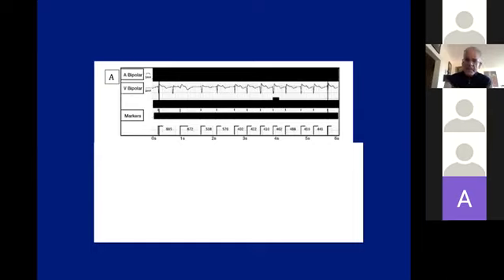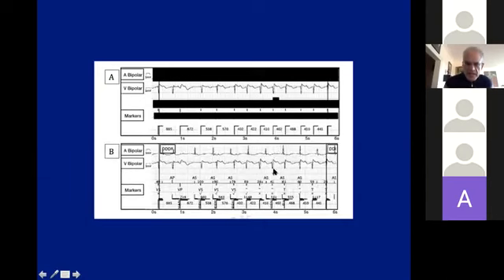It will probably take some time to unmute people, right? Anyways, let me make it simple because this is a teaching case. This was actually VT, even though this is an example that the electrogram morphology can be very, very similar. If you look at the atrial channel on top, you see that there is an AV dissociation. So it's illustrating that the atrial electrogram is actually very helpful.